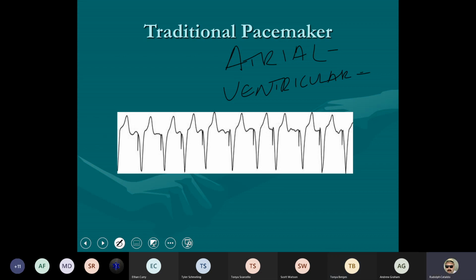Why is this a ventricular pace rhythm looking at it? Oh, because the pace spikes are coming from the ventricular area. The spikes are right in front of the complex. Pace rhythms will always be wide. There's my P wave. The spike is after my P wave.